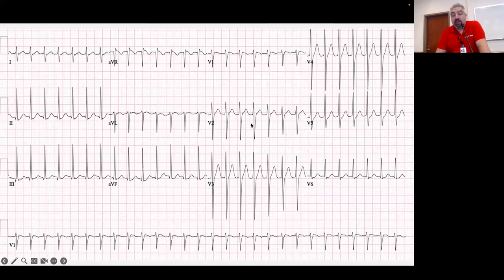Because remember, everything that lines up vertically on the EKG is occurring at the same time. So you can look at this T wave and see, okay, the T wave really starts here. And so if you come straight up, this is really where the start of the T wave is. So if that little blip wasn't there, this would probably come straight down and have this normal shape instead of this little peak right there. Does that answer your question? Yeah. Okay.